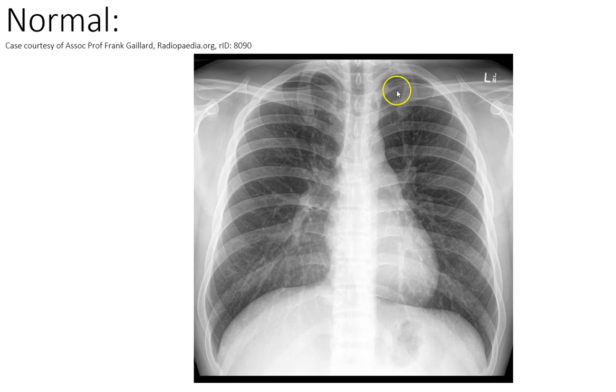Some people look at the whole length of the clavicle, but somebody could have had a trauma, or they could just have a shoulder raised through musculoskeletal malalignment or habit, or old trauma, which might actually not mean that they're rotated at all. So the clavicular head distance is considered to be much more reliable to look at the rotation. So that distance and this distance, in this case, they're very nice and equal.